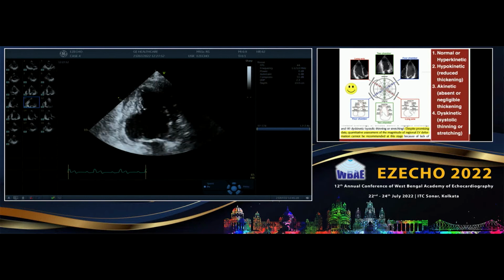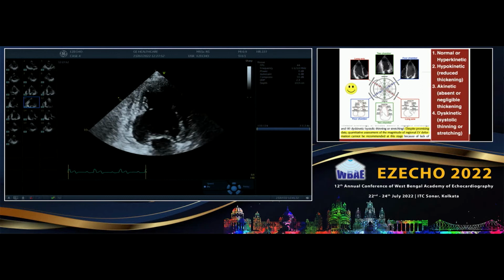It is highly echogenic, but I won't commit myself on that. Should we call it an aneurysm? Yeah, we can say there is an aneurysm. But many times the echogenicity depends upon a lot of technical factors, such as power. We are imaging in harmonics, so whether we should comment, I don't know. We should not commit on it as an aneurysm.